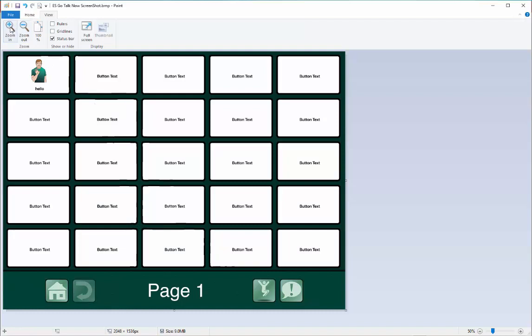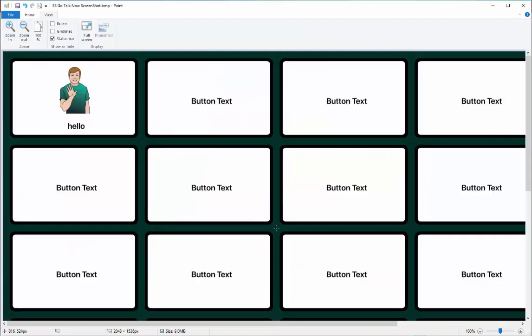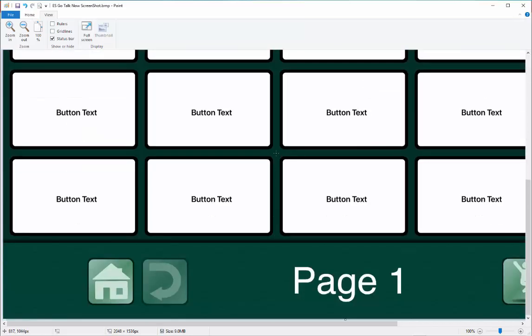I could zoom in and get a little bit more accurate measurement. 817. Whoops, I'm in the wrong place. That's why. 817. Look in the lower left-hand corner here. 817, 1041, as I eyeball the center of that little space there.